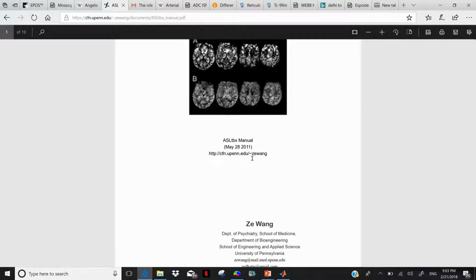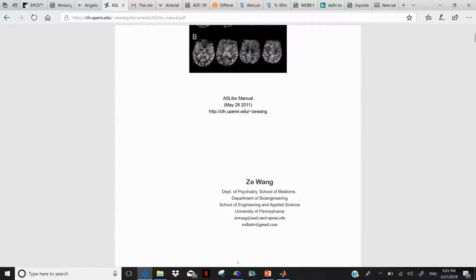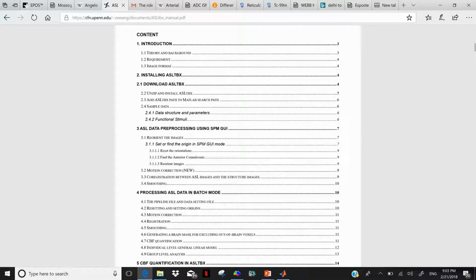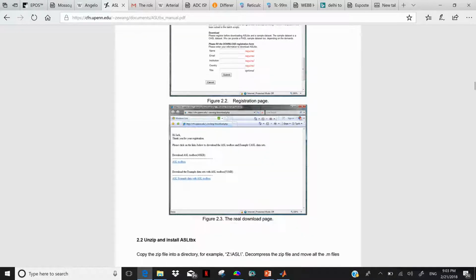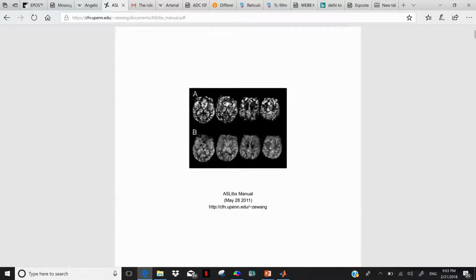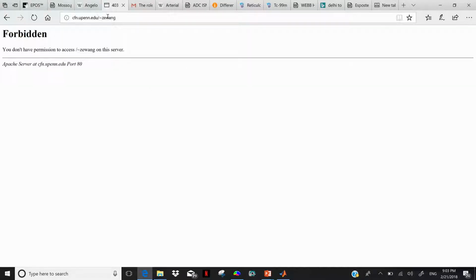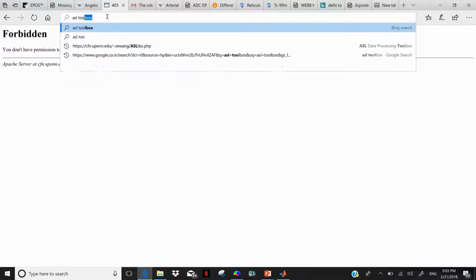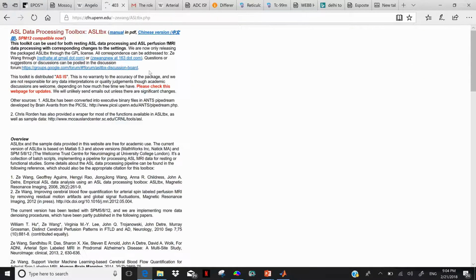Anyway, so this is the ASL toolbox, and this is a very cool guy, Ze Wang, and this is his email. He is very nice and he replies to your email, and that's how I got into this ASL thing. Whenever I have a problem, I email him, and there is also a group, the ASL toolbox 2 group. So what you need to do is go there online and download this toolbox from here.